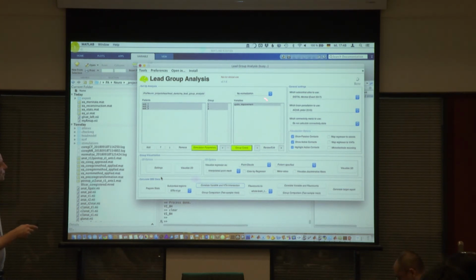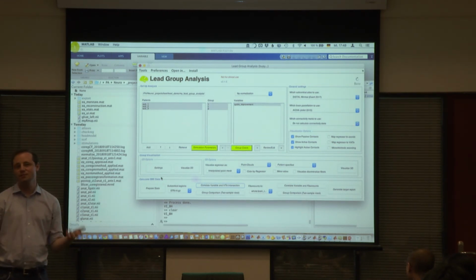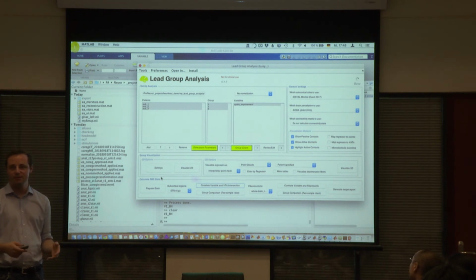If we have two, so one for each hemisphere, something like hemibody scores, it would always map the corresponding one to the corresponding side. If we have one for each contact, of course, it would map them to each contact.